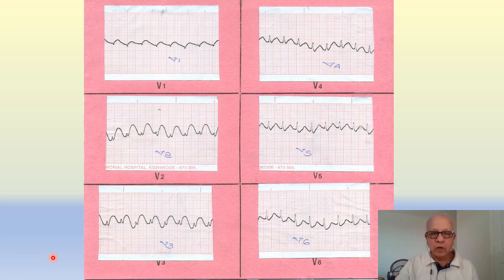So friends, now we'll go on to the answers to this question. Now you see only the precordial leads here. I have told you already. If you look carefully, the precordial leads show an ST elevation, isn't it? An ST elevation in V1, V2 and V3, most important.